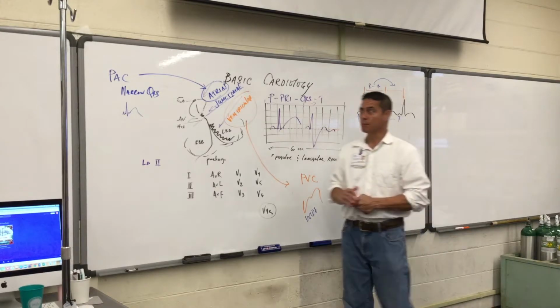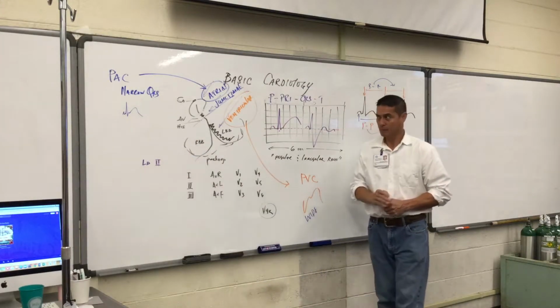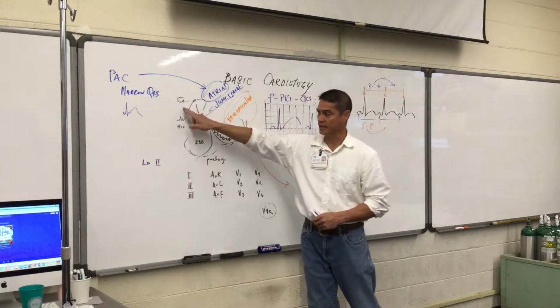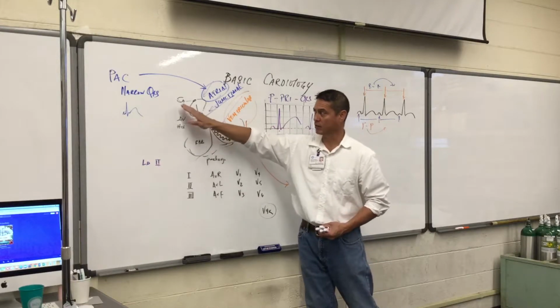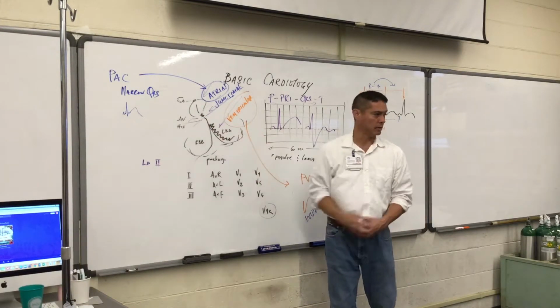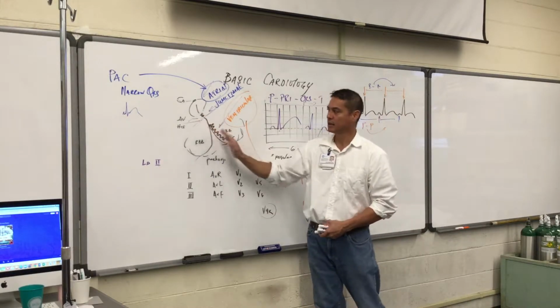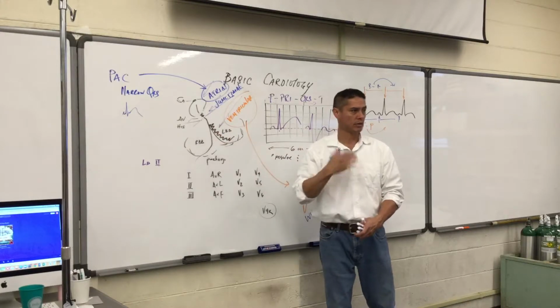The one that probably will have a pulse, more than likely, is the atrial one, because it's firing from up in the atria. It's causing the ventricles to depolarize, and what happens is it allows the atria to then fill and pre-fill the ventricles.